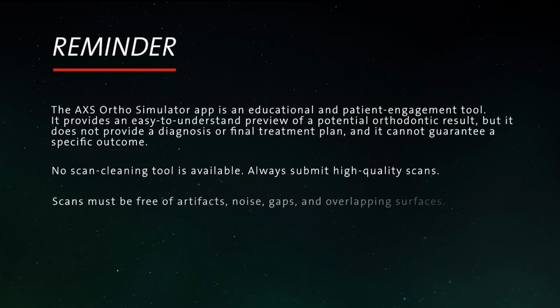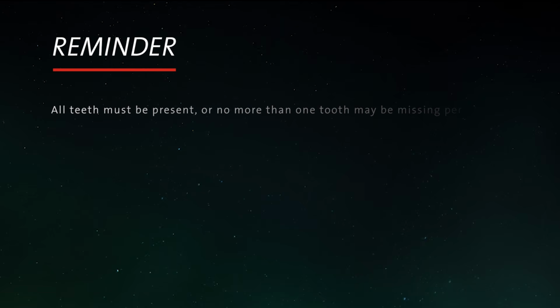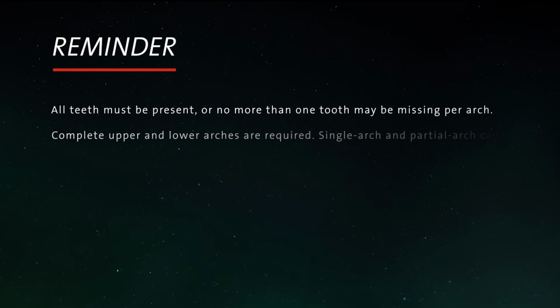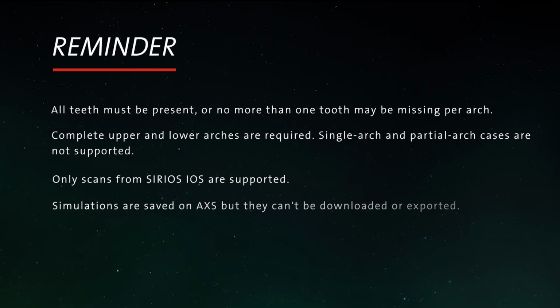No scan cleaning tool is available. Always submit high-quality scans. Scans must be free of artifacts, noise, gaps, and overlapping surfaces. All teeth must be present, or no more than one tooth may be missing per arch. Complete upper and lower arches are required. Single arch and partial arch cases are not supported. Only scans from SIRIOS IOS are supported. Simulations are saved on AXS, but they can't be downloaded or exported.